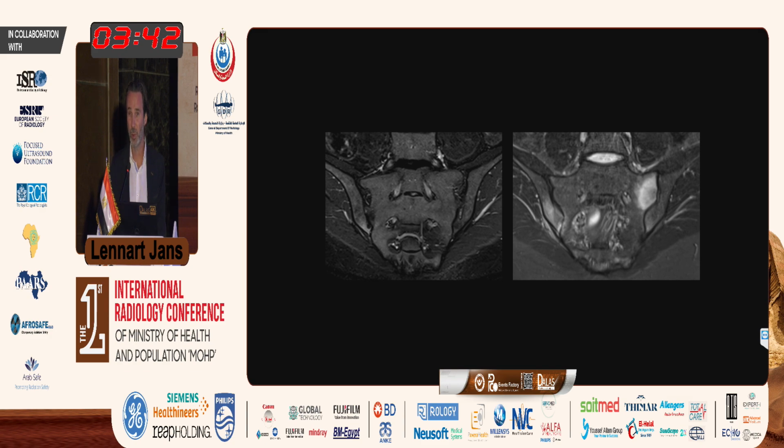So it's really important, especially in rheumatic diseases where you do the follow-up, that you know if some previous examinations have been obtained. So ask your patient if he had some examination somewhere, and ask your clinician to write down a lot of clinical details, because they will help you. On the left image, I just wouldn't know. It could go any way. But now I know that this really was sacroiliitis, but that the treatment is working because the bone marrow edema is disappearing.